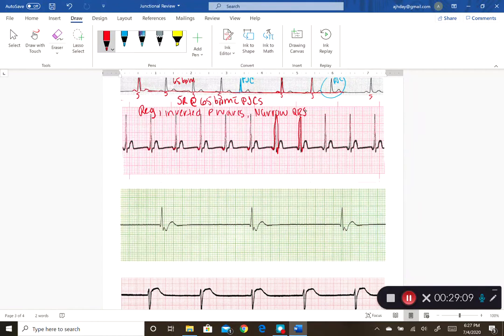And let's figure out what my rate is. We'll look over here because I didn't write all over it. So I have 5, 10, 11, 12, 13, 14. So I know that it's probably going to be over 100. I'm going to do 1500 divided by 14, which gives me a rate of 107.